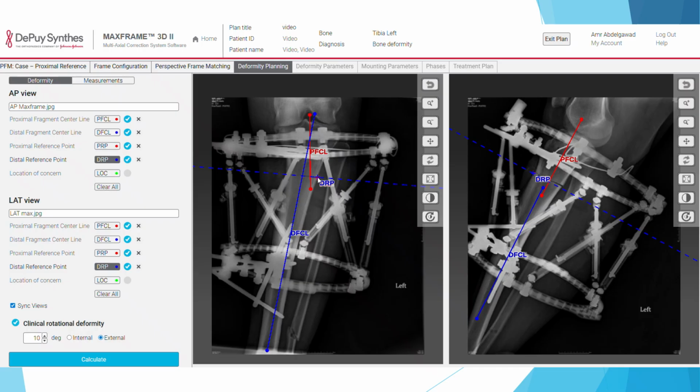So basically, let's say that you decided to go to the distal, and let's say that you put the distal here. So that's immediately, and then here that tells you that the line should pass. So your dot should be in the lateral, very close to this line. If it's far away, it will confuse the numbers of the shortening and lengthening. So that's why you have to put it very close. It doesn't have to be exactly on the line, but very close to the line.